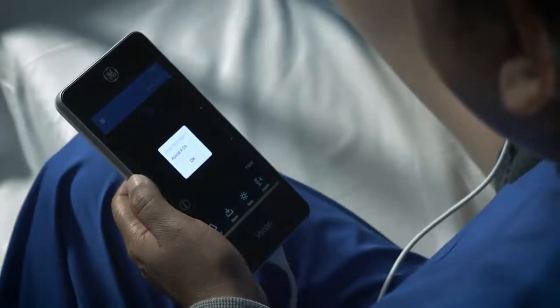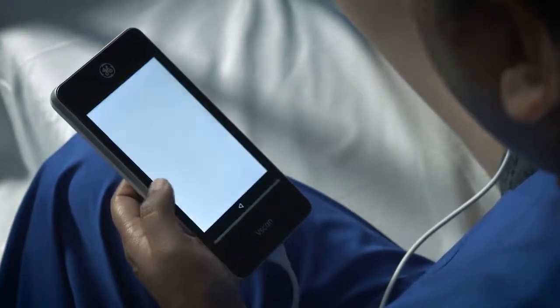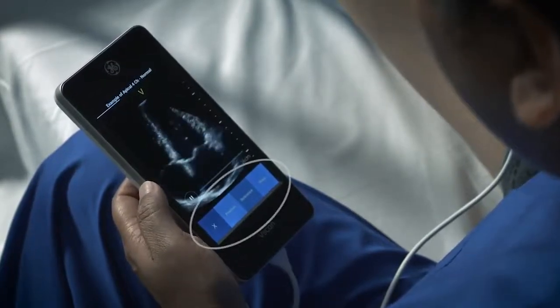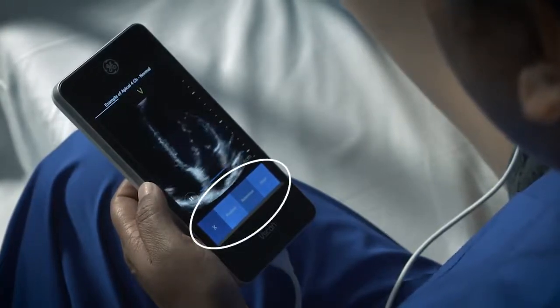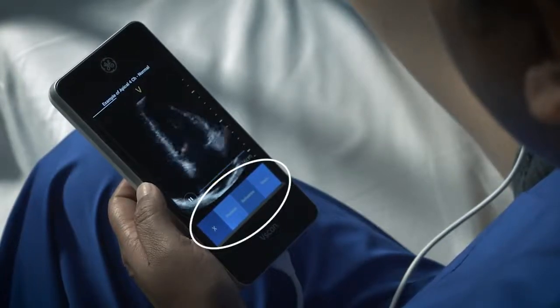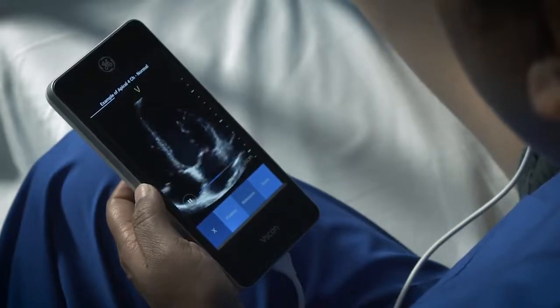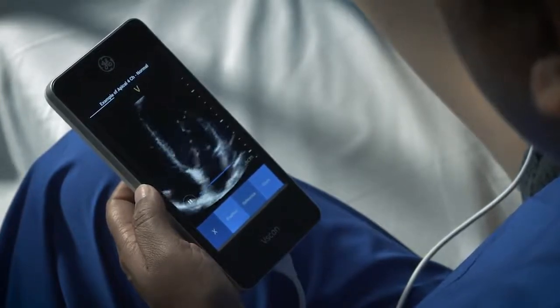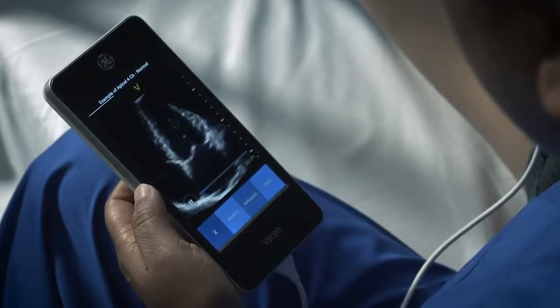If you need reference information for a chosen step, tap to select the eye or information symbol. At the bottom of the display, you will have access to position, reference ultrasound images, and the list of steps for this protocol. Reference information defaults to the Reference tab for the step. This provides clinical reference images for the active scan plane.